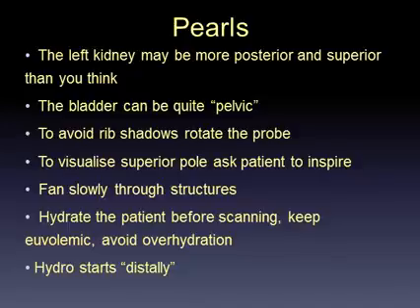And hydro starts distally. What I mean by that is, it starts at the bottom of the pelvis, and it will fill the pelvis from the bottom up. Certainly if you can see what you think is some hydro, but then beneath that you see a collapsed pelvis, then it's probably not hydro. It's probably normal fluid coming into the collecting system.